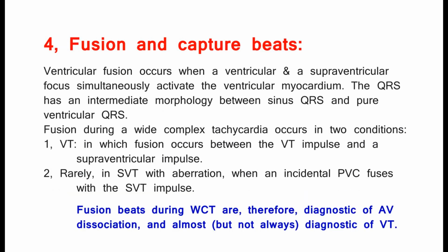4. Fusion and capture beats. Ventricular fusion occurs when a ventricular and a supraventricular focus simultaneously activate the ventricular myocardium. The QRS has an intermediate morphology between sinus QRS and pure ventricular QRS. Fusion during a wide complex tachycardia occurs in two conditions.